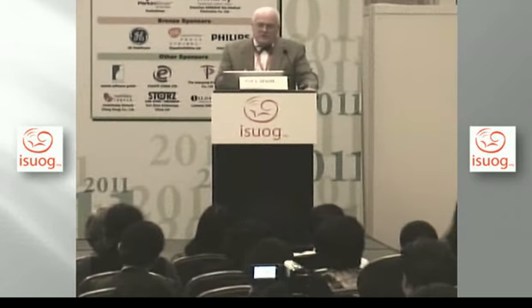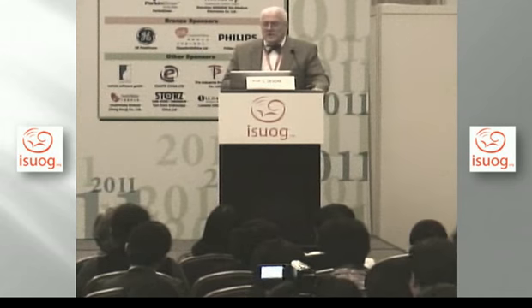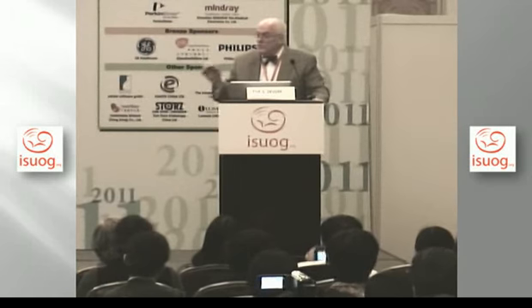Now, you could use it for screening, I guess, with the TUI approach. Some people have done that, but in our practice, we use it when we have pathology. And that's the real advantage. But they have so many tools that you can use, it's important to understand how to use the tools, so when the time comes that you have to use them, you know how to use them.